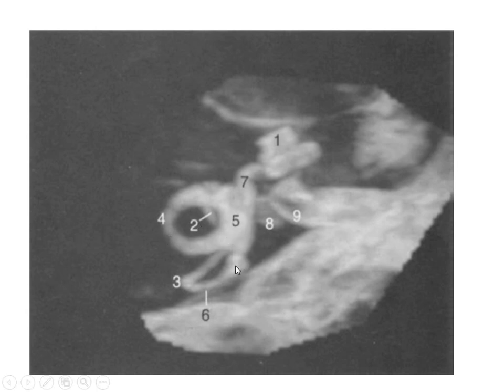What's the sequence of MRI? Sequence T2. What kind of T2? We do T2 for the brain, but it will not be like that. What's the difference here?